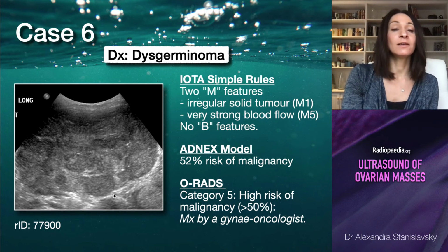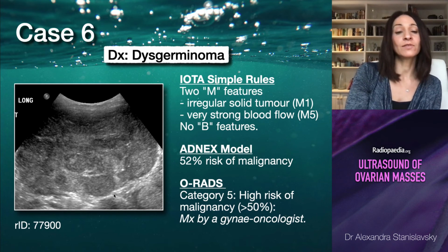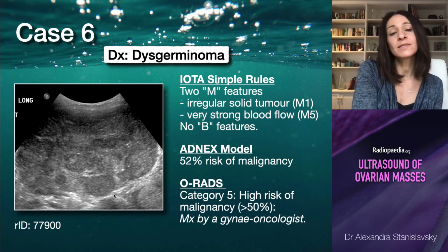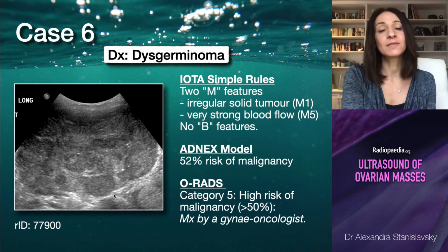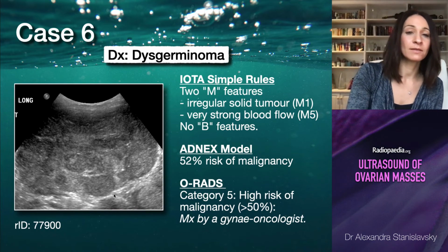So that's actually, whilst not enough to state the diagnosis confidently on imaging alone, something perhaps to look for in tumors in younger patients. It's an appearance that's been associated specifically with dysgerminomas.